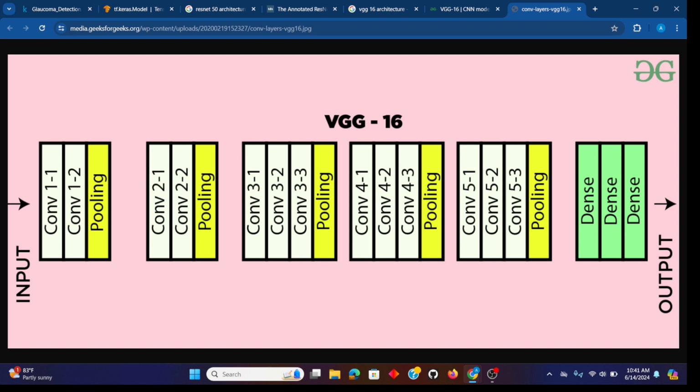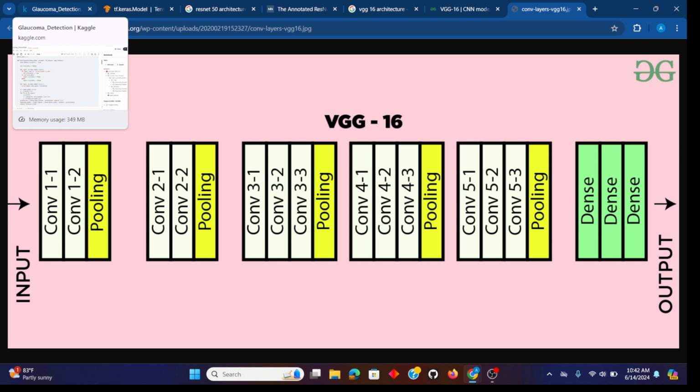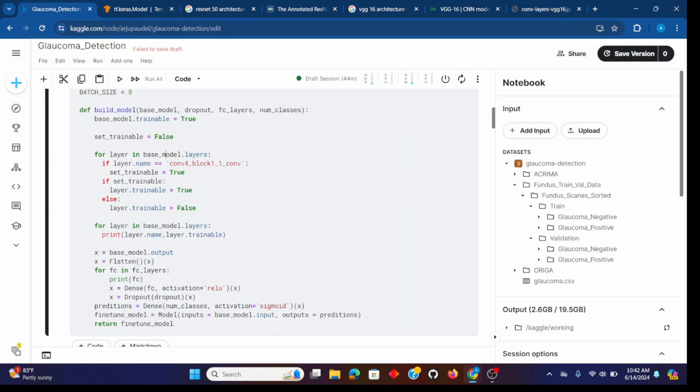So we are applying fine tuning, which means we are not freezing the whole thing, but also opening up and training two blocks, or one block. This is called fine tuning. From here to here the model is frozen and we are not training it, and we are just training from here to here. Because we have pretty specific data, different from the general categories it has learned, we have to use fine tuning, not the feature extraction process. What I'm doing in this loop is setting which layers are trainable and which are not.